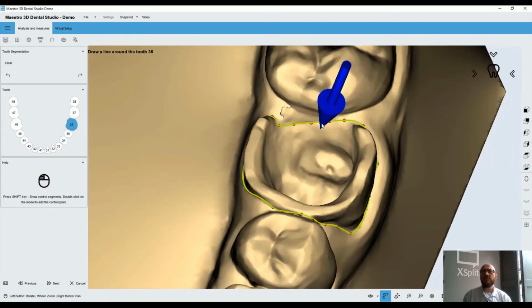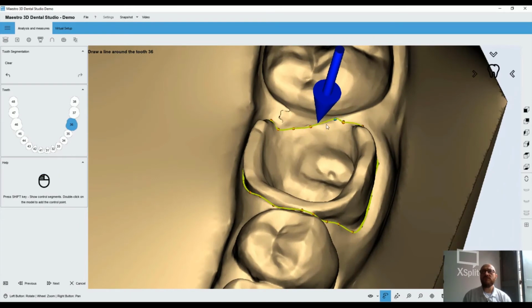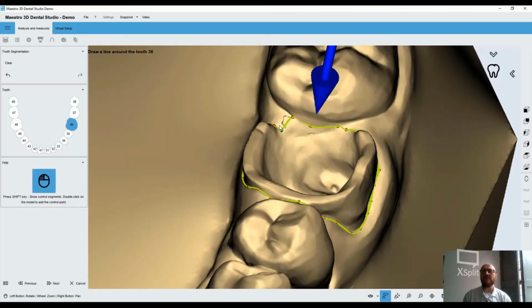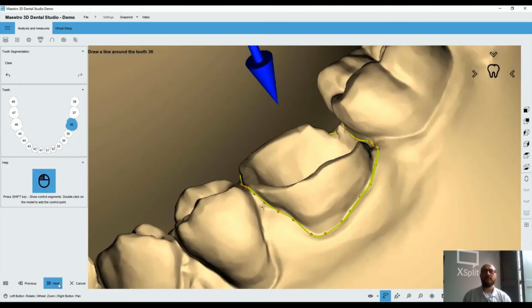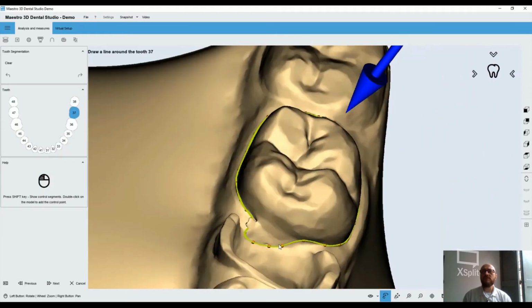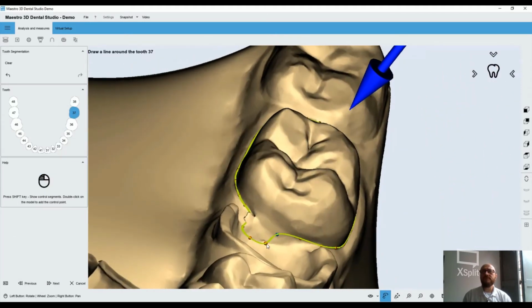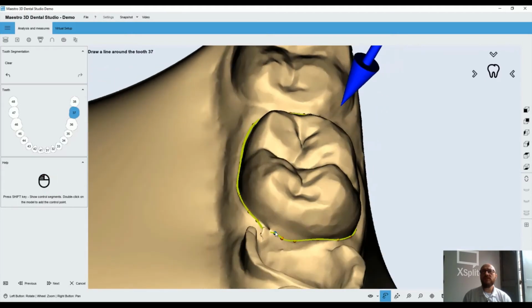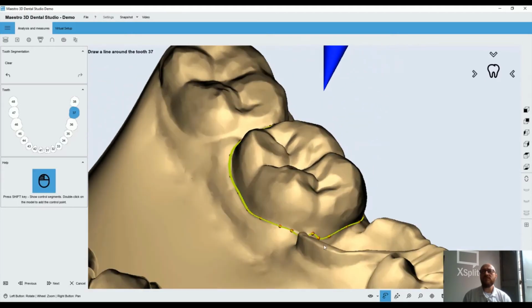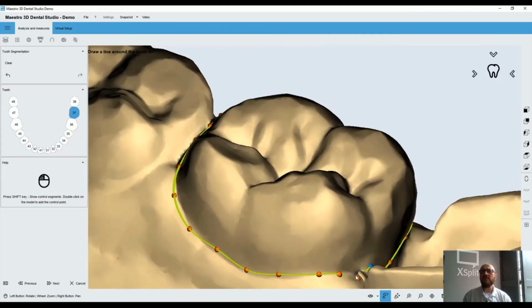Okay, I'm sure I will have some issues here. This is an element that I will extract, because it's also possible, as I told you before, to extract teeth. Next, try to fix this, just deleting one point. For deleting one point, just double click on the left mouse button, and the last one.